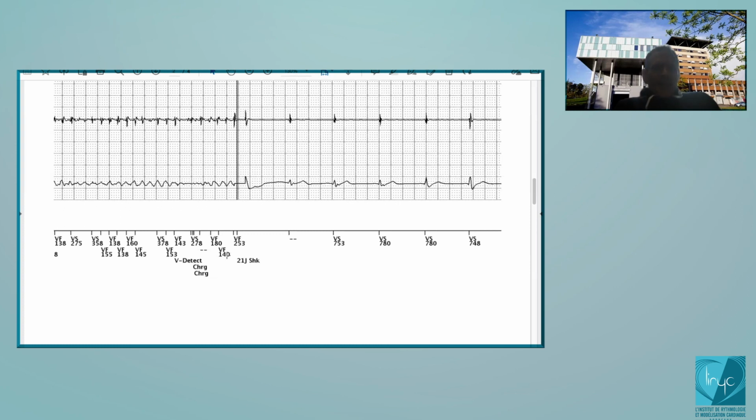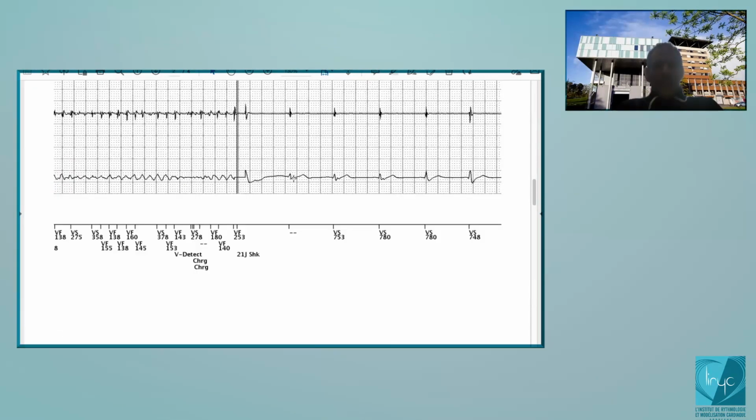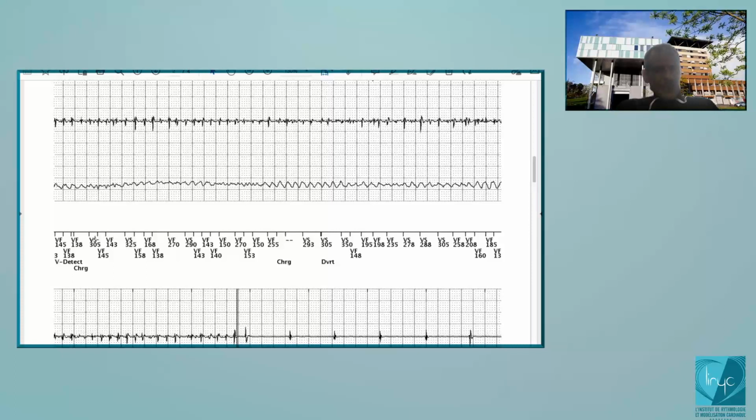You see, at this time, if the shock has been diverted once, it cannot be diverted a second time, but you will still wait for the 500 milliseconds of the divert window. You understand that? So at this time, even if it is VS, the shock is committed, it will be delivered, but you will wait for the 500 milliseconds before delivering the shock. It's clear? Yeah.